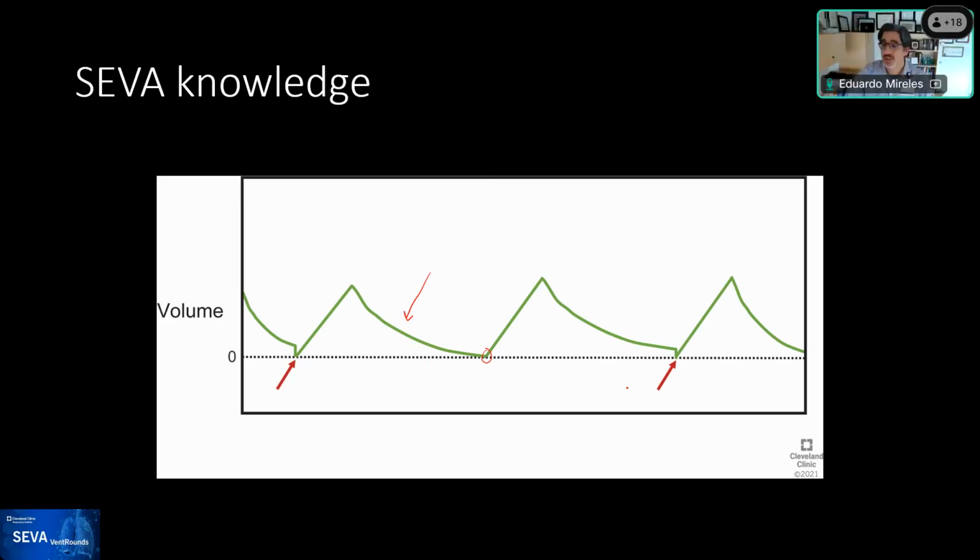Yeah, that's a great point, and I'm thinking about how to make this graph better. Perhaps a better graph would also show that sometimes the tidal volume goes below the baseline and disappears. That demonstrates that the patient is exhaling, activated the expiratory muscles, or perhaps had air trapped from the prior breath. This happens often with double triggering, or two breaths in a row. Now the patient has two breaths inside, but the volume resets.